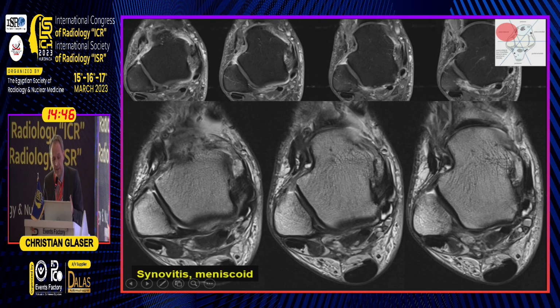And as in this case, in axial T2 weighted images, you would see that's the lowermost aspect of the syndesmosis. There is a little bit of too much tissue, and because it's squeezed into this triangle between the talus and the fibula, it takes a triangular or meniscoid shape, and then you end up at the upper edge of the LFTA. So contrast, and again, we do give contrast, obviously.